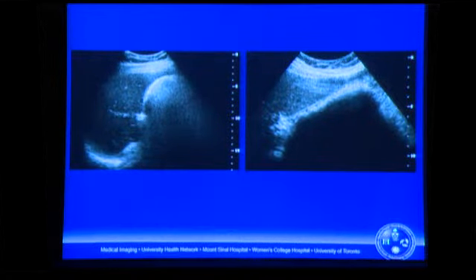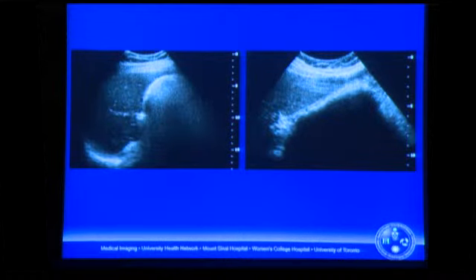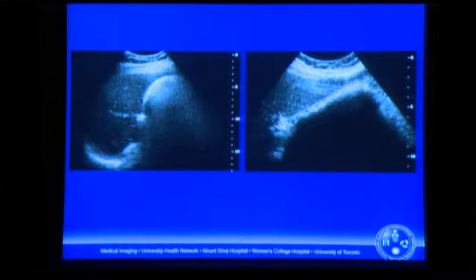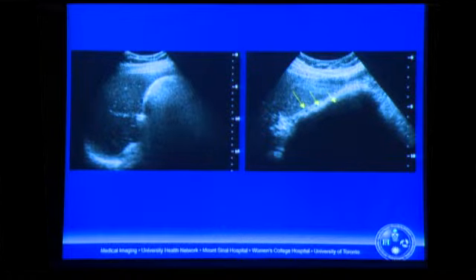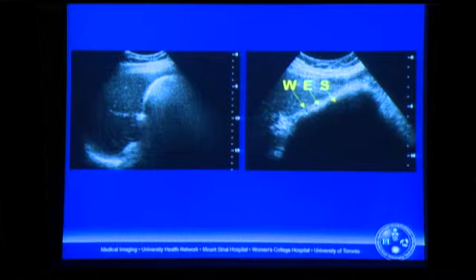Now, how do we contrast emphysematous cholecystitis with a gallbladder filled with stones? So our emphysematous cholecystitis is on your left, and on your right we have a distinctly different image, because here we can actually resolve a very thin echogenic line, which is the gallbladder wall, and then there's a second acoustic interface that's more irregular, which brings about a very clean shadow, which is distinctly different from the reverberation artifact from gas. And this is called the wall echo shadow sign, or the WES sign of a gallbladder filled with gallstones. So that's the WES sign.